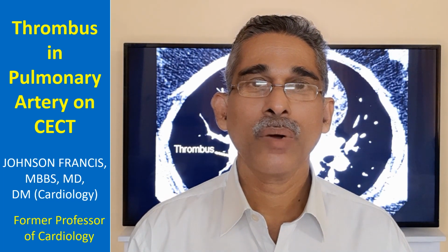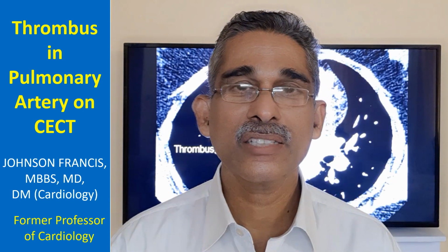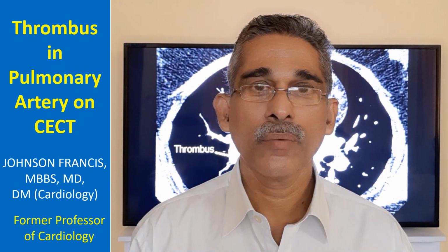Usually when pulmonary embolism is suspected, we only find evidence of dilatation of right sided chambers and increase in pulmonary artery pressures by echocardiography being a bedside tool.